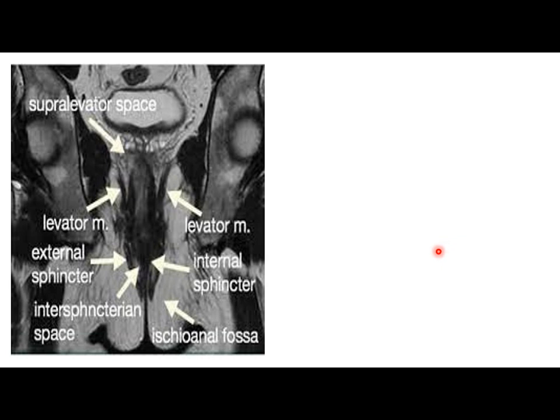And this is the normal anatomy, in order to know. This is the levator ani muscle. Any collection below it is considered infralevator, and any collection or abnormal signal intensity above it is supralevator. The problem with supralevator bleeding is that it's usually diagnosed late. Why? Because it bleeds into the retroperitoneum and keeps bleeding internally, extending upward. No one can feel anything, but the patient presents with shock and severe hypotension. There's a delay in the diagnosis.